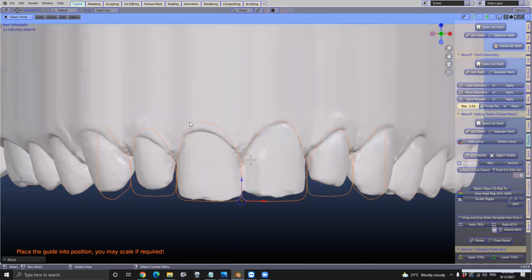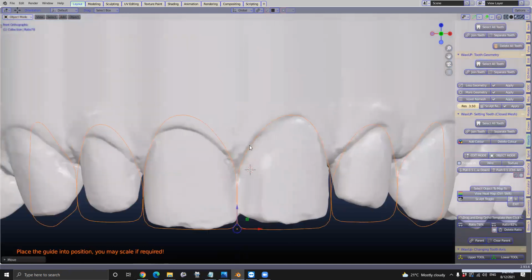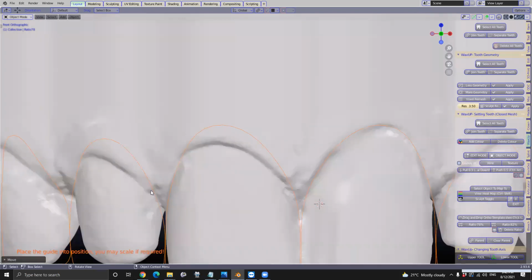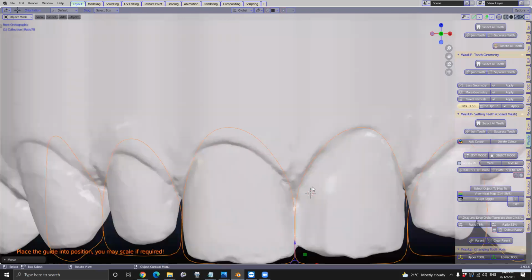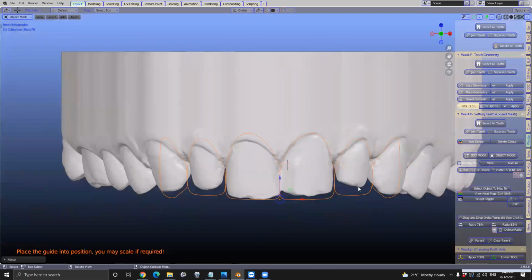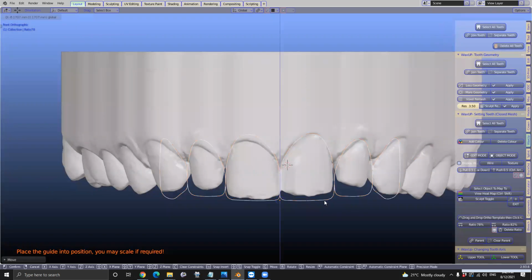And that's really good. Like here, for example, we can carve away the gum exactly like we've done over here. We could carve away the gum a little bit and the tissue over here as well. And then we put our diagnostic teeth on top of it. Yeah. Excellent. So I think pre-planning is the key. So if there are any questions, that would be a good time to ask.